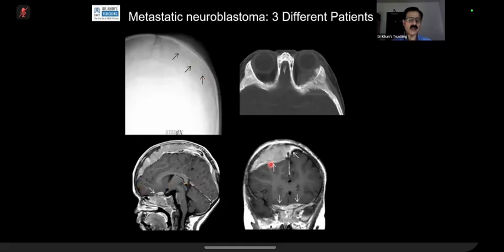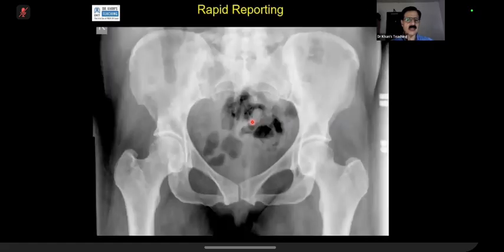And this MR actually tells you the pathophysiology, and you can make the radiology. Basically, the metastasis has involved the dura, it is a dural metastasis. From there, it has gone into the skull also. And this is another example where we can see a dural mets which has gone into the lateral wing of the sphenoid, causing this secondary bony destruction and host reaction. So skull X-ray also is in the same category.